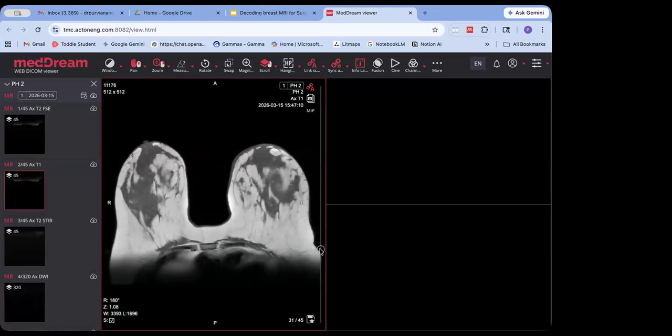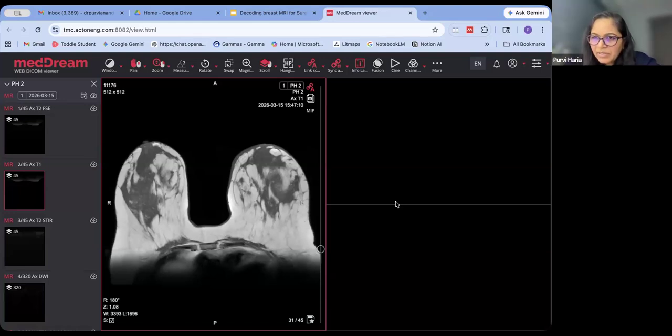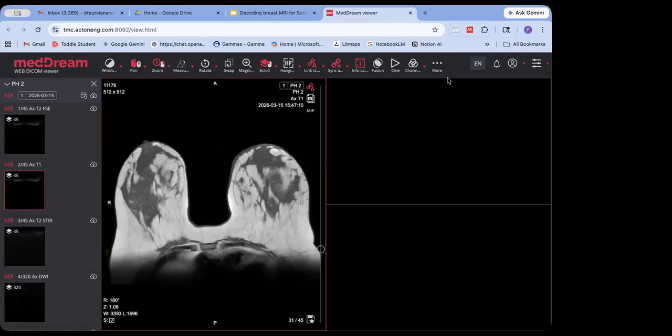I would think, Shafiq, if you want to comment here, since the question was yours to raise: when you start from the top, what you're looking at would be 12 o'clock. When you come to the bottom, what you're looking at is 6 o'clock. 3 and 9 obviously are based on position. And you would expect that topographically we are mapping both depth as well as width by going down the image, is what you're suggesting. Yes, that's what I wanted to know. I think what we can get from the radiologist is the coordinates, and then we'll have to map it out on the breast as such.